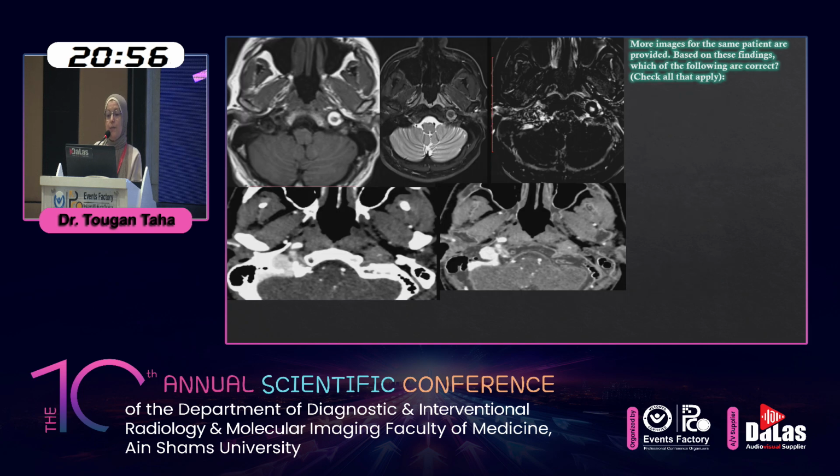Here are more images for the same patient. Based on these findings, which of the following are correct? Please check all that apply.